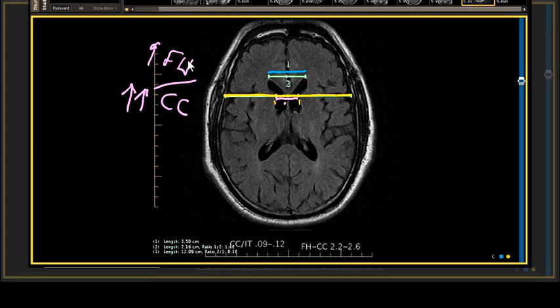So the intercaudate distance dominates these ratios, and they can be used to assess subjectively and objectively the character of the caudate and surrounding structures. So now let's move on to a bit of a clinical discussion of Huntington's chorea now that we have those basic measurements.